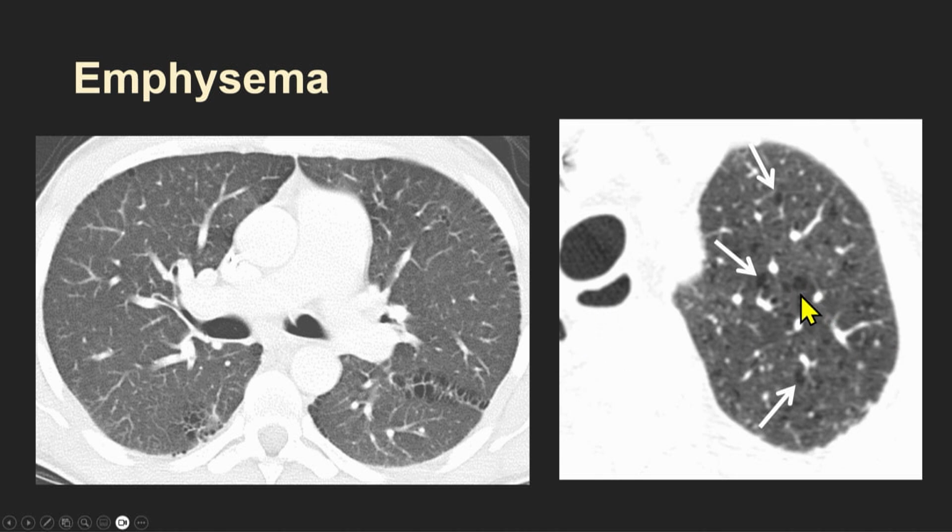They're going to have the central lobular dot, but they're not cysts, because to be a cyst, you really have to have a thin wall. And these areas of central lobular emphysema classically will not have thin walls. They'll just be areas of blackness, areas of hypodensity, essentially lung destruction.